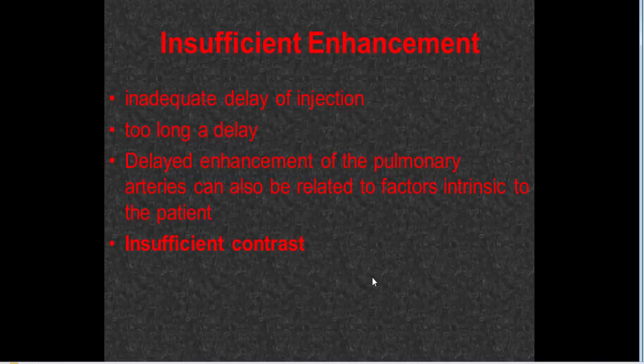Insufficient enhancement. This is one which gives us causes of false negative. Inadequate delay of injection, too long delayed enhancement of the pulmonary arteries can also be related to factors intrinsic to the patient, insufficient contrast. So we must do proper technique.